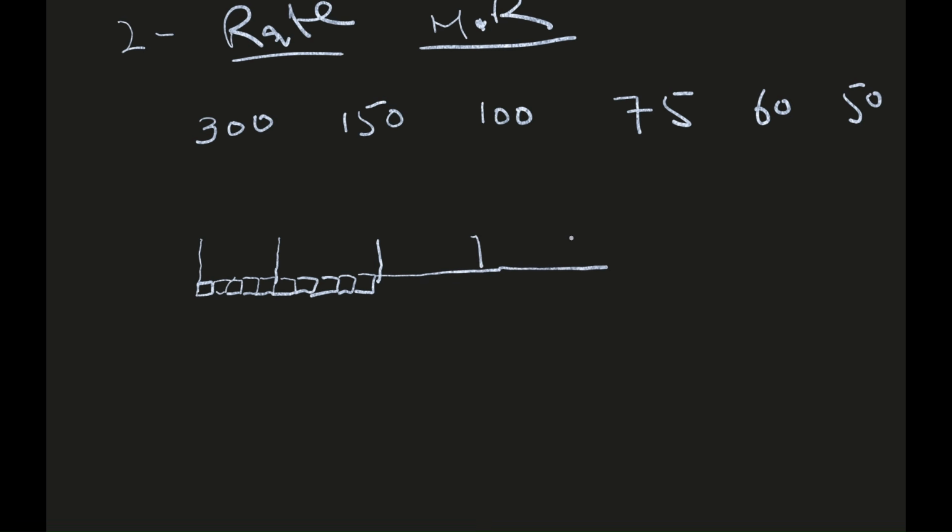I won't be drawing it any further. Now place all these numbers over here: 300, 150, 100, 75, 60, and then 50.